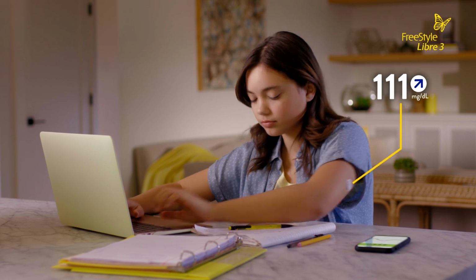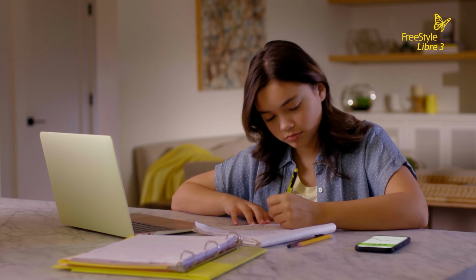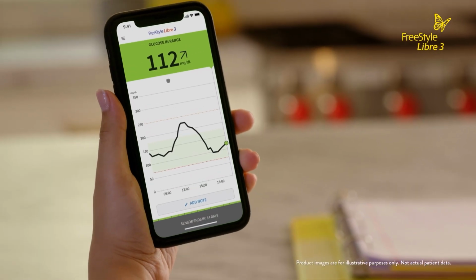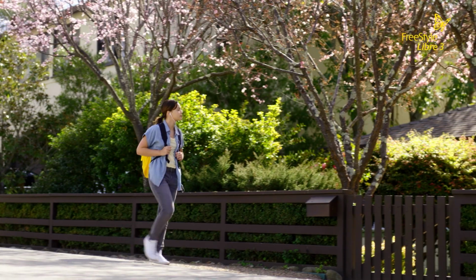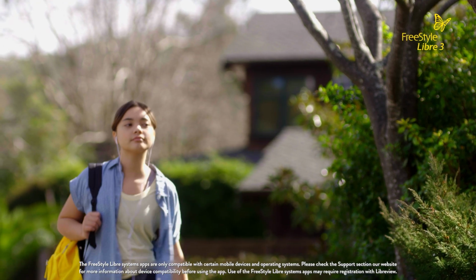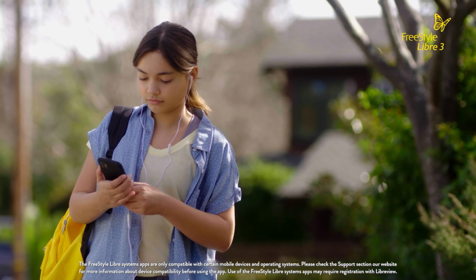With the FreeStyle Libre 3 system, your logbook and reports are easy to access from the app and can provide valuable insights to help you manage your glucose daily. And you can feel confident knowing you're getting the full picture because your reports are generated from glucose readings sent directly from your sensor to the app every minute.